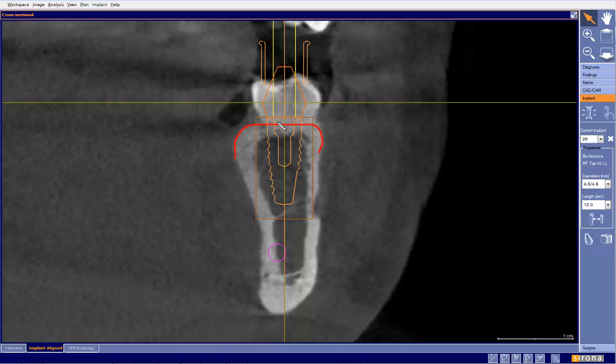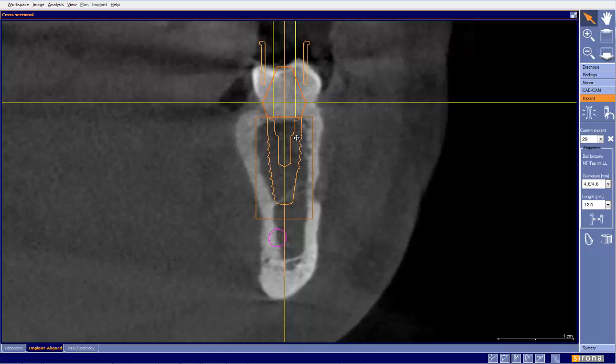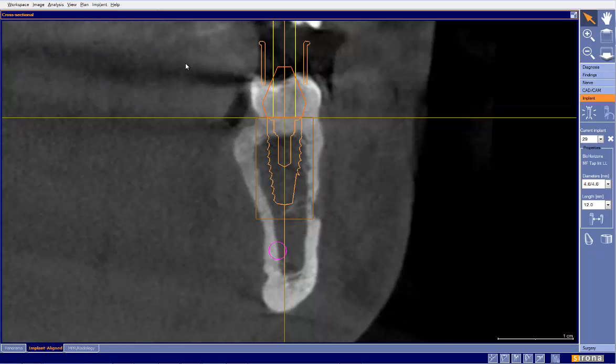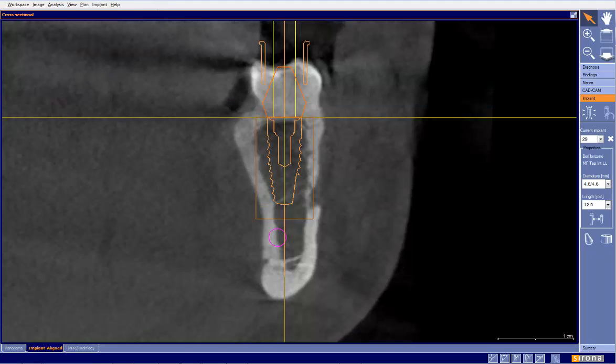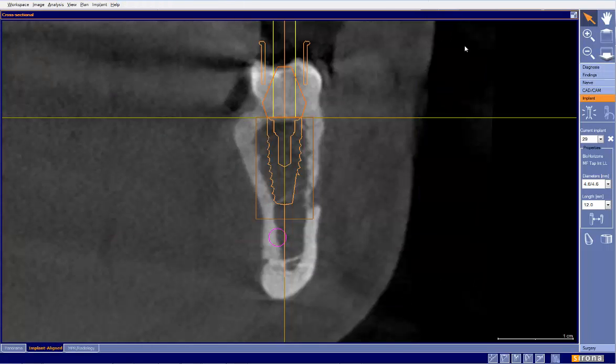And based on that, we can already see that our implant is above that bone line. And what I would actually like to see is that implant go down to the bone line. And then on immediate placements in retained primary teeth, I actually like us to see it go below the bone line to simulate and create some recession so that we can get the necks of the teeth more ideal. So this would be the more ideal implant placement here. So here we can take a comparison of that versus that. And that should give you an idea of the main thing I would change here.